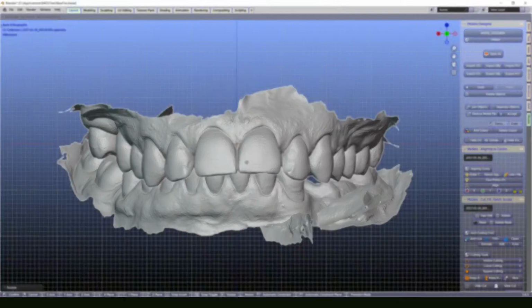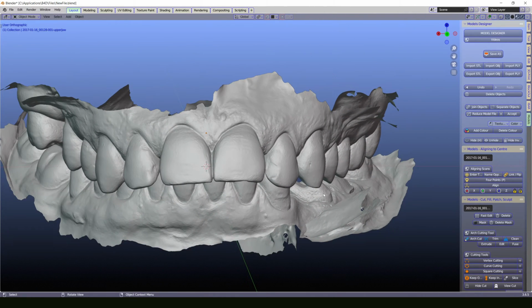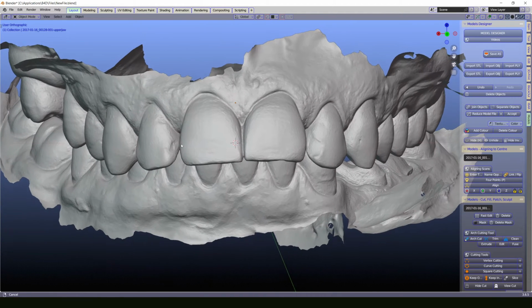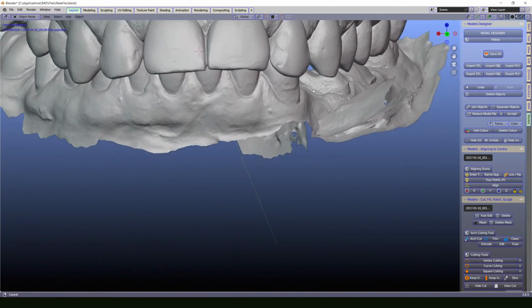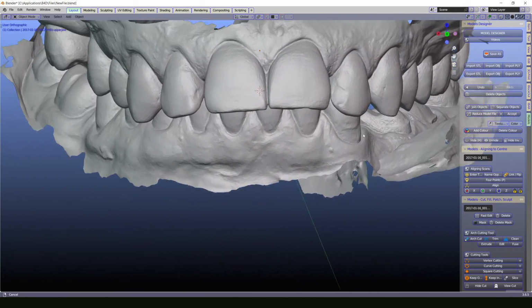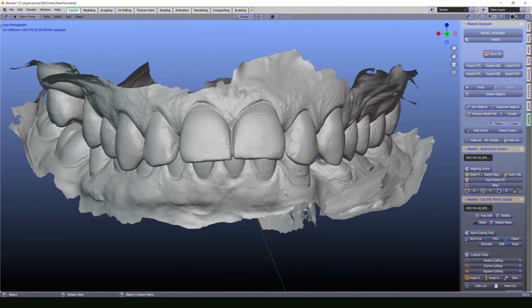G and after that Z. And for me, it would be much more comfortable if I could work with those jaws separately to have a nice look around. By the way, I'm moving these models by holding Shift on my keyboard and pushing the scroll wheel on the mouse simultaneously. Yep. So, how to hide the model? Just push the left mouse button. You can see the selected model highlighted.